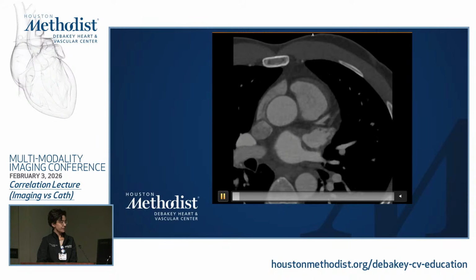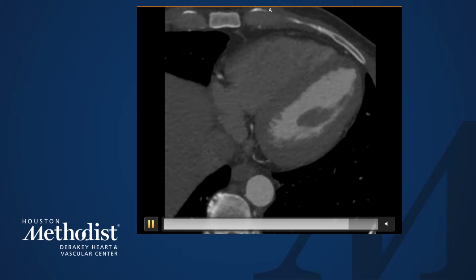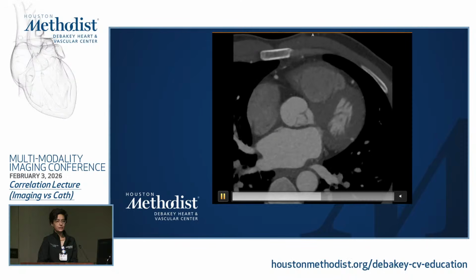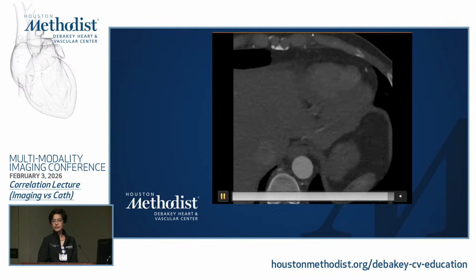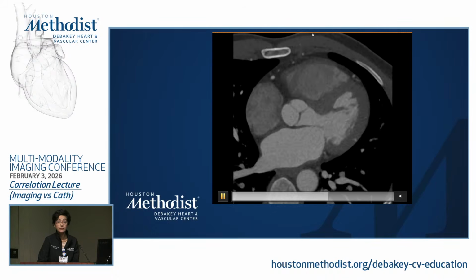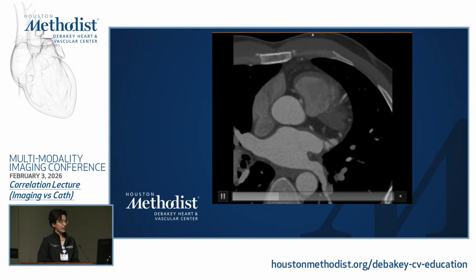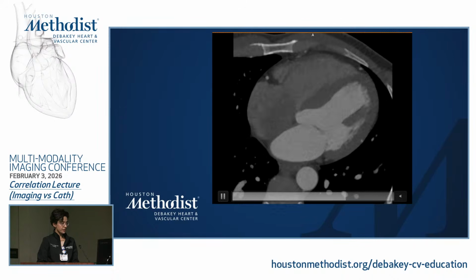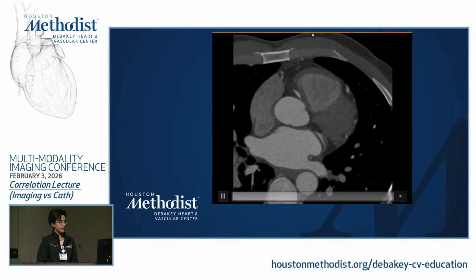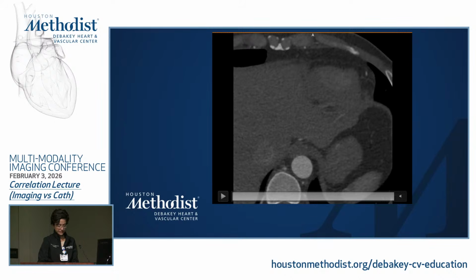Okay. And this is the coronary CT angiogram. Is there anyone who can tell what is wrong here? Anomalous RCA. Exactly. So there's an anomalous RCA coming from the left coronary cusp. The RCA is dominant, and there's no other coronary atherosclerosis or stenosis in other vessels.